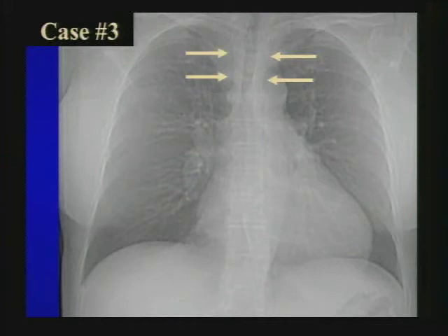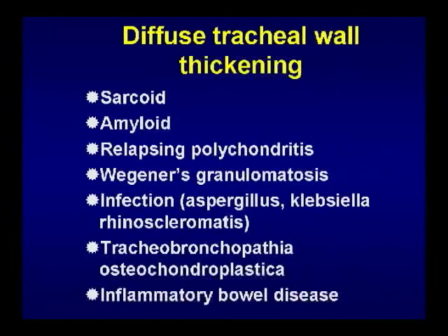If you don't have this and you have just a CT image, the question is, does it involve an extensive amount of the trachea or is it a very focal lesion? Certainly very focal lesions can be like post-intubation strictures and tuberculosis and a couple of trauma and things like that. But if it's extensive, it's the Bizarro differential. So here's the Bizarro. We call these the oids: amyloid, sarcoid, and the Wegenoid. There it is, Wegenoid. Those are the oids. Those are usually in the same differential.